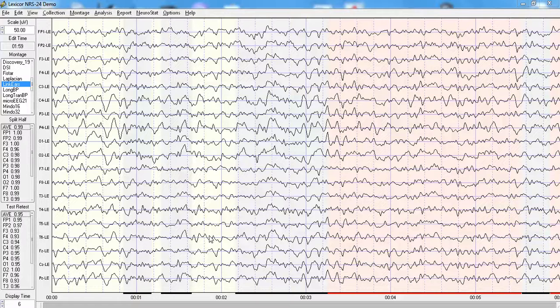The phase slope index is fast enough to calculate so that one can implement it in neurofeedback. And we will be doing that. We will be implementing phase slope index in both the surface neurofeedback modules inside of NeuroGuide as well as the LORETA neurofeedback modules. But for now, let me show you what the surface effective connectivity is as a measure of the flow of information in the brain.